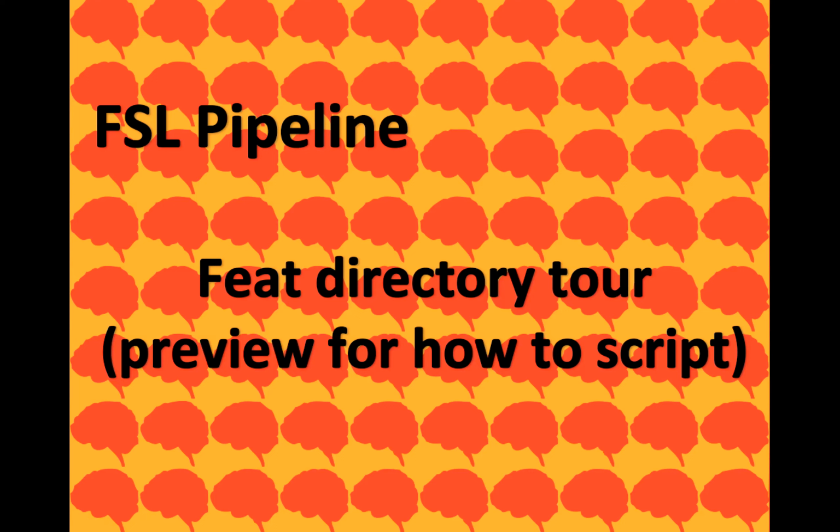Hi, so we're continuing down the FSL pipeline, and today I want to step you through some of the files that Feat creates. I'm not going to know what all of them are, but I'll point out the important ones and the ones that I use most frequently. Especially important is one of the files I'll point out, which is basically the file we edit to script the level 1 analyses for the rest of the subjects and runs.